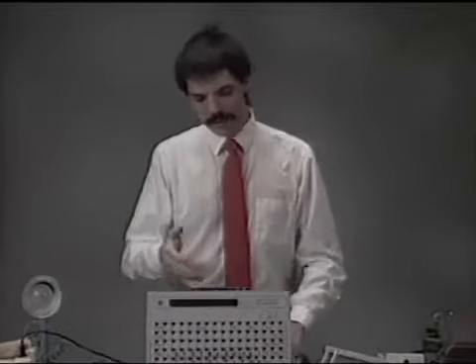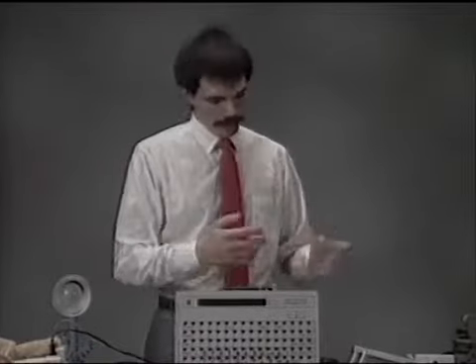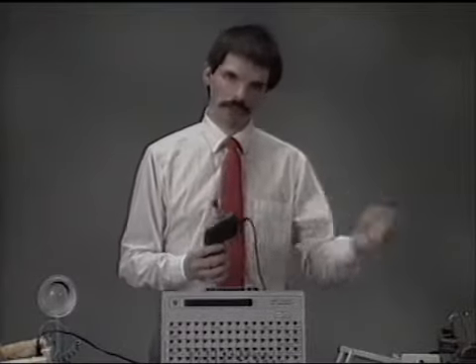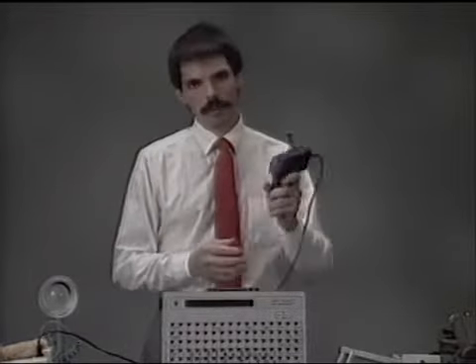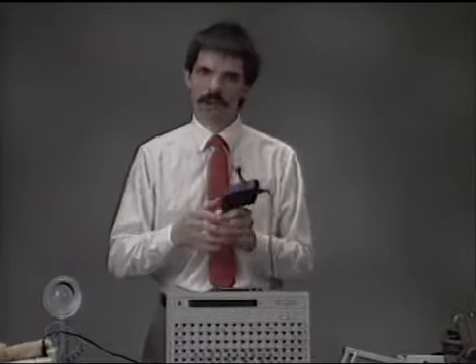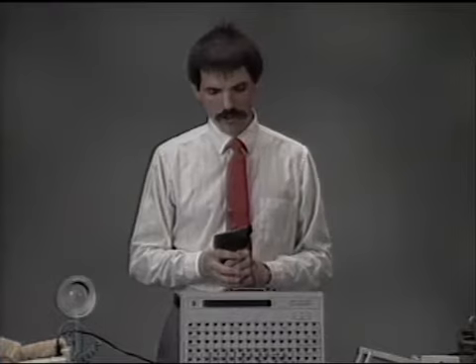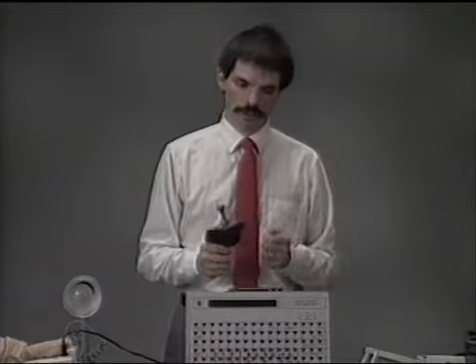Now, if we look at this type of communication aid, and we go back, I'm operating this one with a joystick again, and we get into the same problem we had with environmental controls. If I'm operating my power wheelchair with a joystick, do I then have to switch to operate my communication aid with a joystick, or my environmental control with a joystick? Well, again, going back to that wheelchair system, there are ways around it. So let's take a look at that for a moment.